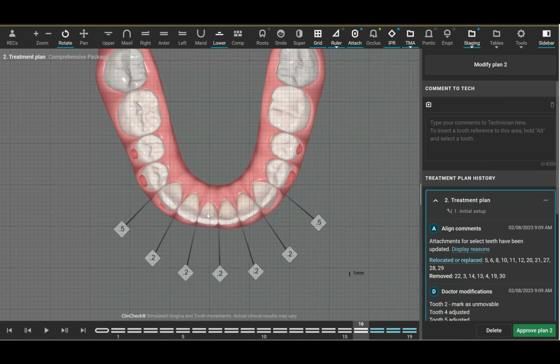So what I'm going to do is I'll just submit a written instruction that says, please remove the round trip movement of tooth 25. Because if you just say remove the round trip movement, then it's not going to move it facial and then move it back. I'm going to say just move it to its final position, no forward movement. And that written instruction should take care of it.